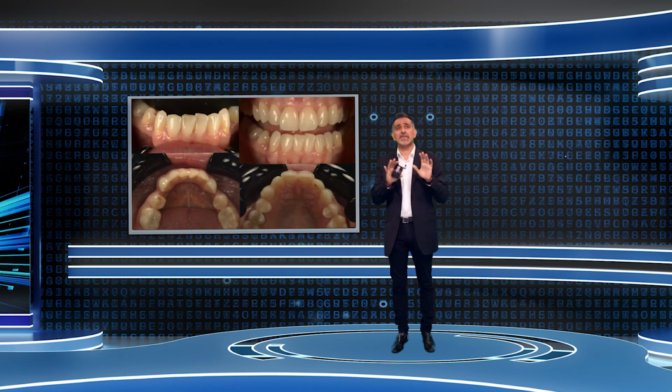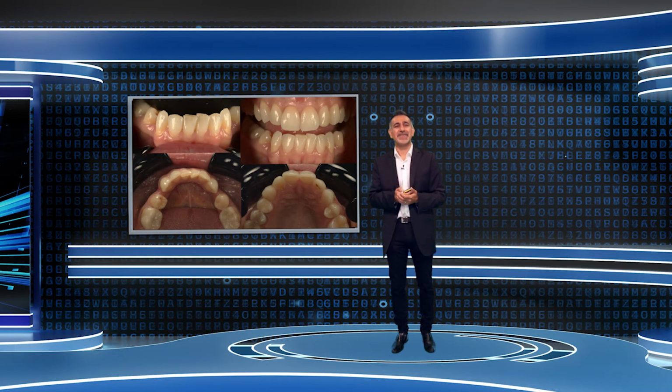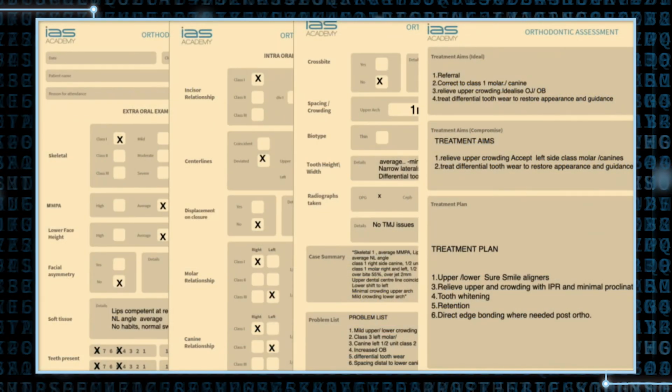You can see the lower teeth have started to sort of over time shift over a little bit to the right side of the screen, and she's got the edge wear that you commonly see associated with the uppers slicing against those lower teeth. Obviously two missing premolars at the lowers, which makes things a little bit more complex. But ultimately we're looking at obviously a slightly compromised case here.